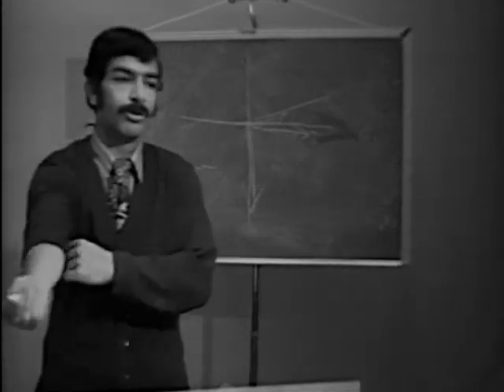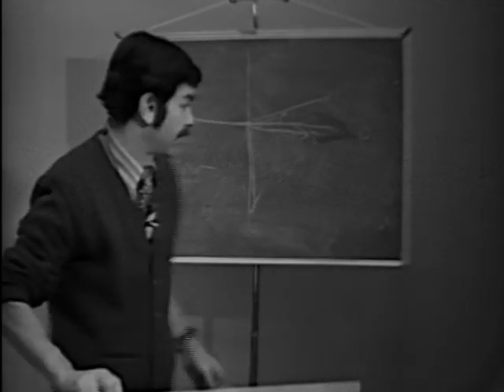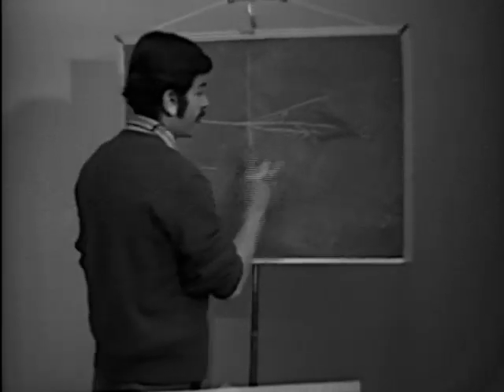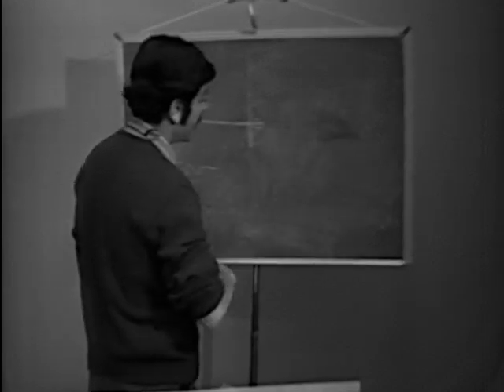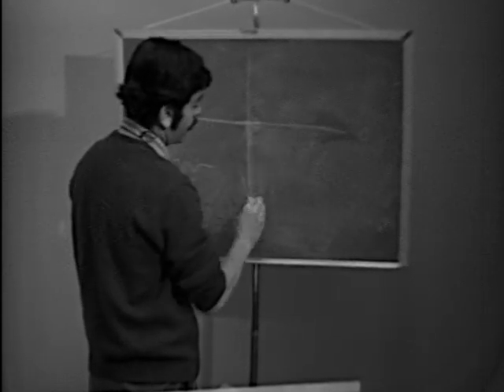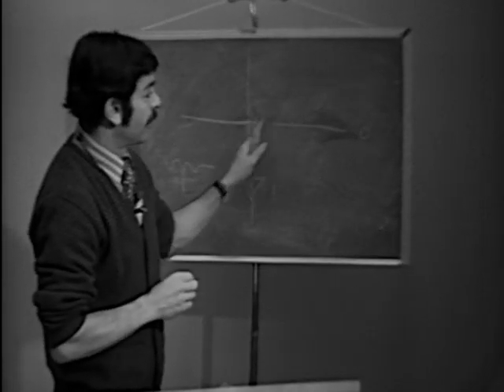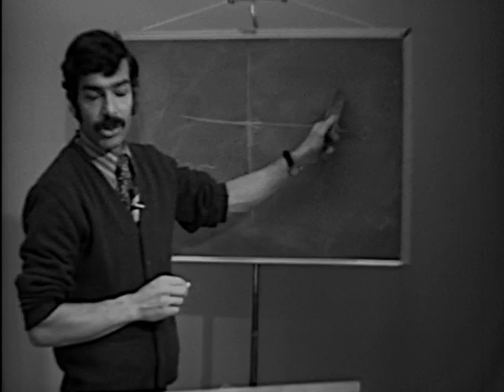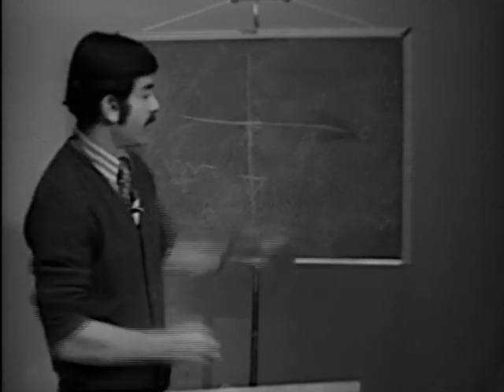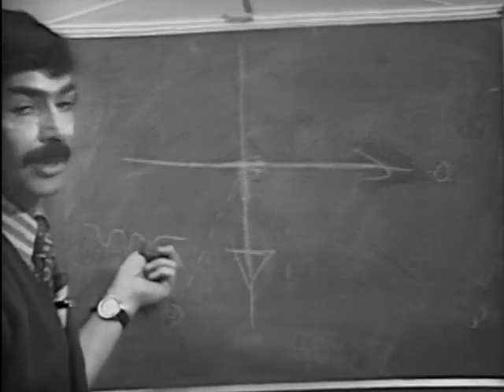So the exceptions to the rule are then, if you're dealing with a vertical heart, and now we're talking a little bit about position, we're dealing with a vertical heart. This would be a heart that has a QRS axis that's going straight down. That would be a vertical heart. Dealing with a vertical heart, it might be all right to have an inverted T wave in AVL. If we're dealing with a horizontal heart or a horizontal axis, it might be all right to have an inverted T wave in lead 3.